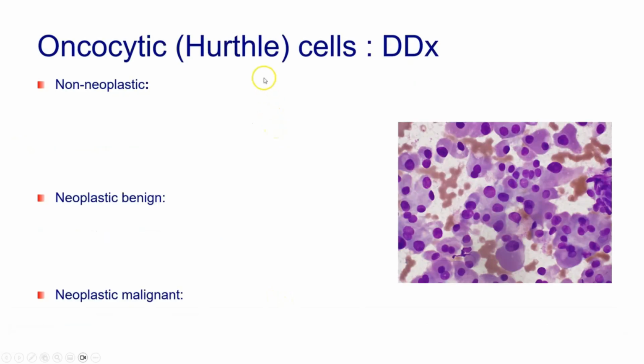So first of all, when thinking about oncocytic cells, the Hürthle cell is the older term referring to cells of this appearance, but moving forward with the latest WHO histology blue book, the term oncocytic is favored over Hürthle cells. So these are cells with abundant granular cytoplasm, and sometimes this cytoplasm appears rather dense, especially on the air-dried smears, and the cytoplasm is usually full of mitochondria.